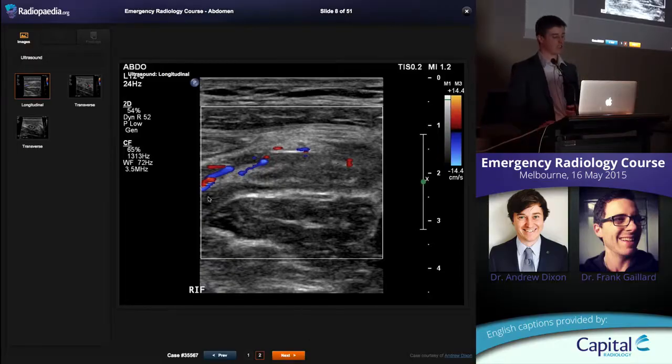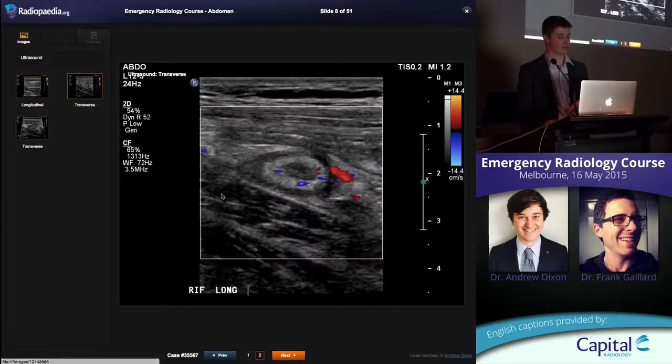This patient has the classic ultrasound appearance of appendicitis. So there's this blind ending tubular structure in the right iliac fossa. There's a hyperemia next to it, and it kind of gets these layers in it because the wall gets edematous. And on a transverse view, that was a longitudinal view, on the transverse view you get these multiple layers, hypoechoic, echogenic, and then hypoechoic again with surrounding inflammation.